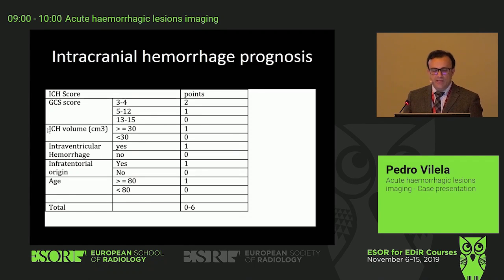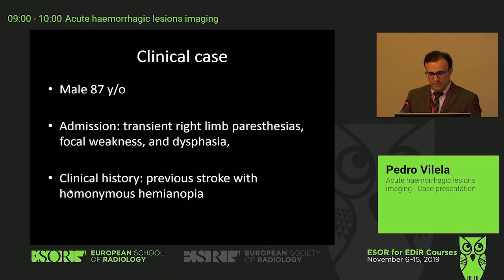And as you see, the volume is important, the presence of intraventricular hemorrhage is important, and the location is also important.